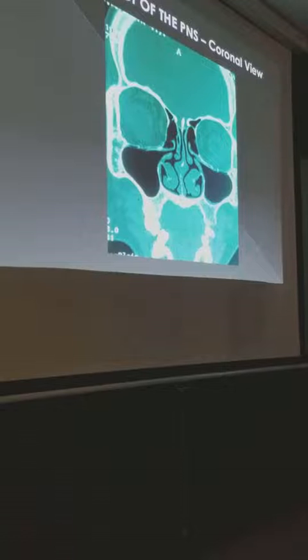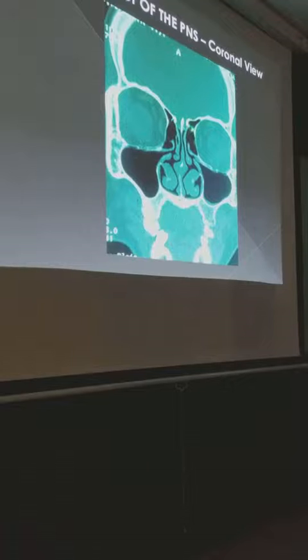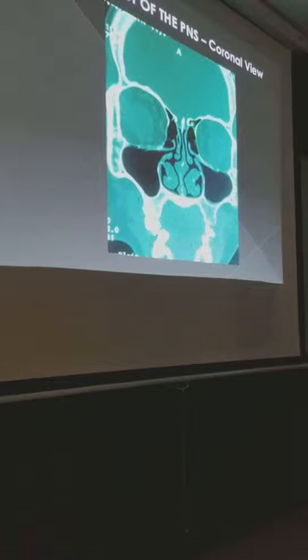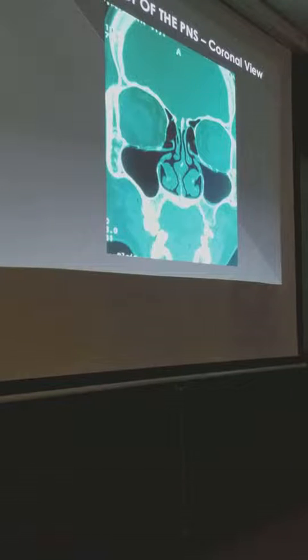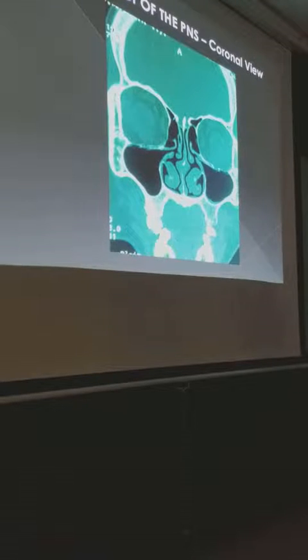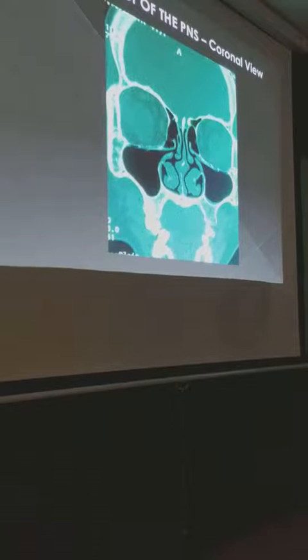So it's about 1/10 the thickness of this one. So talagang when you're working in this area, you better be careful. You don't want to stay too medial because this is where you can cause the leak. And ito, worse pa to because if you hit this, magre-retract yan. And it can lead to a retrobulbar hematoma. No? So this is unusual because normally it hugs the dome of the roof, no?